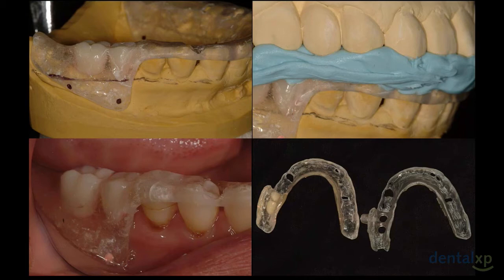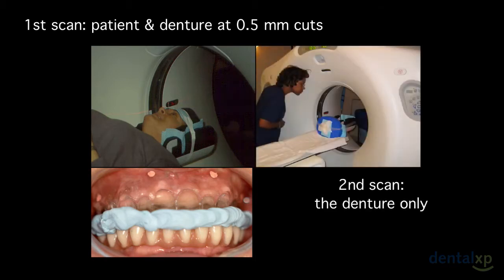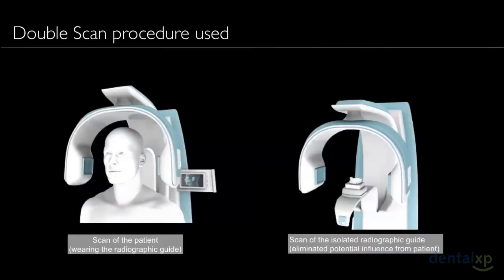Between 6 to 8 fiducial markers are placed around the radiographic template so that it can then be scanned in a dual scan technique. So the patient is first scanned using about 0.4 to 0.5 millimeter cuts, and then the second scan is of the radiographic template only.